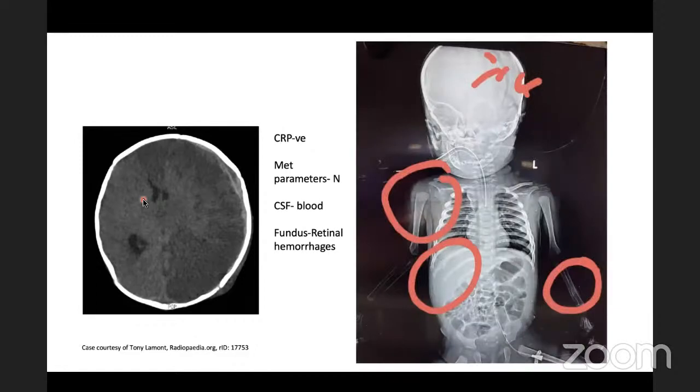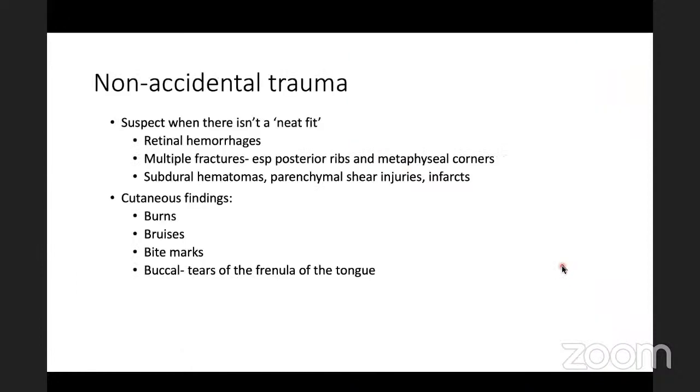Most of these patients have skeletal abnormalities. If you do a skeletal survey or an infantogram, you can see that there is sutural diastasis. The sutures have been separated. You have a dislocation of the right shoulder. You can have many healed fractures with callus formation, both in the posterior part of the ribs as well as, in this particular patient, on the left side of the radius and ulna. So this is a very ominous diagnosis.